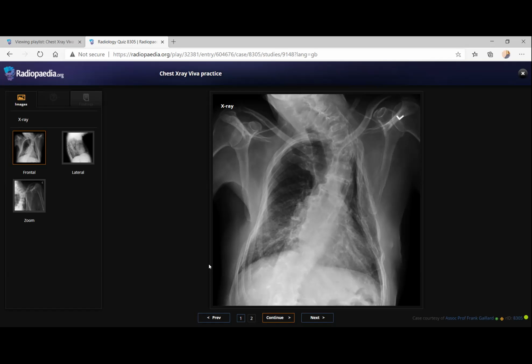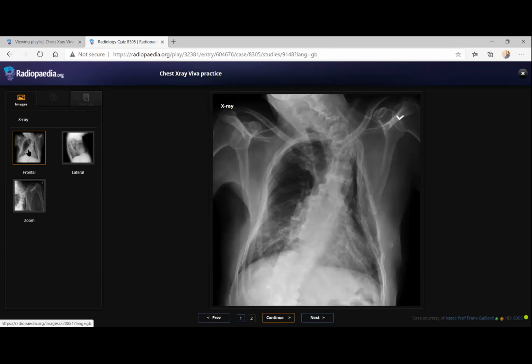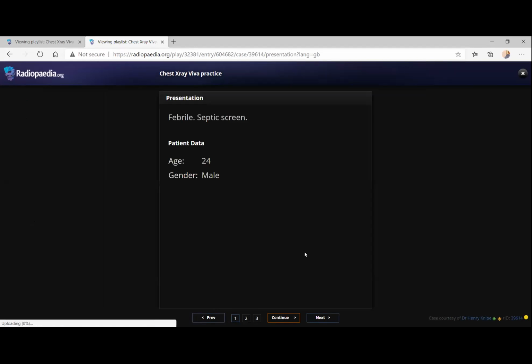Okay. So I would like to compare with the previous X-rays. However, can I see the lateral view, please? Okay, that's non-contributory. If I give you the lateral, you have to read it. If you don't know, then don't ask. Okay, I'm not sure what kind of surgery. If you don't know, you just have to skip the film. Yes, skip the case because I really don't know.